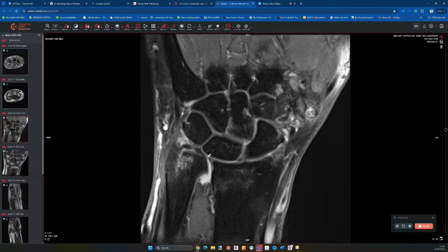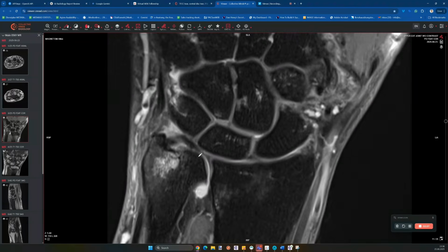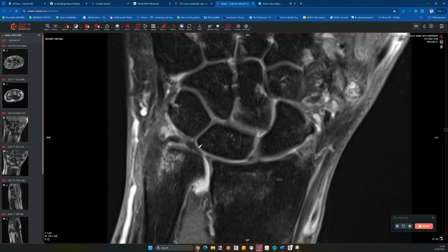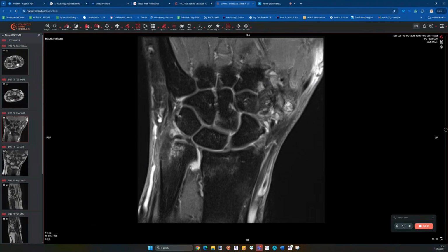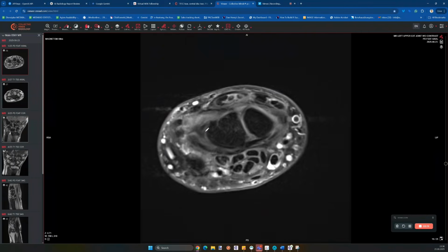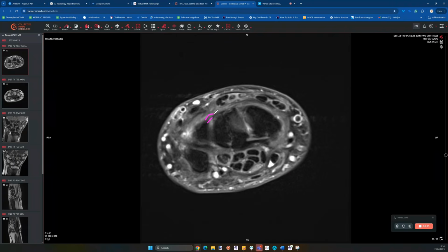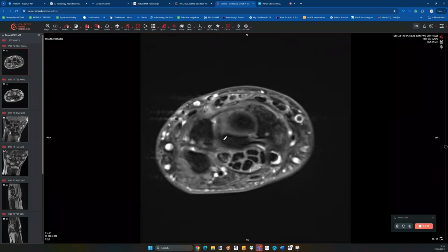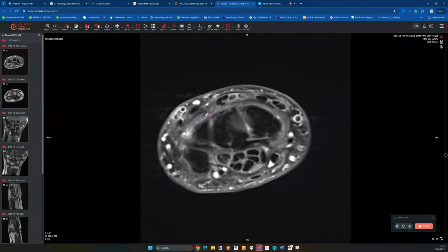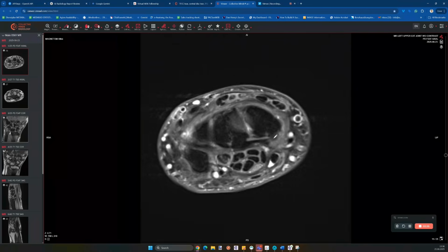LT ligament, we don't really know. I think the resolution is not really giving us enough information to be sure about the membranous portion here. This bit here is still disc, and I wouldn't be surprised if there is a perforation of the LT ligament membranous portion. Now let's try to find the LT ligament dorsal and volar one. So we got the dorsal one. We see somewhere here the volar one. I think LT ligament, the two main components, maybe some degeneration of the dorsal one. Volar one, I think, would just go with okay. Membranous portion not well seen.